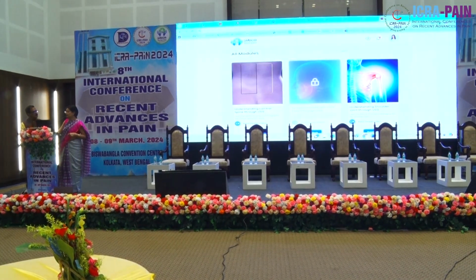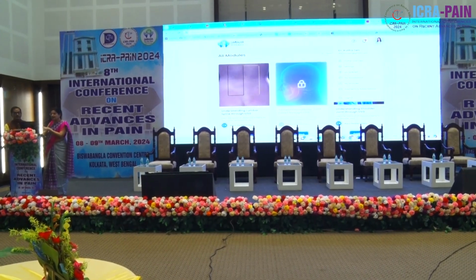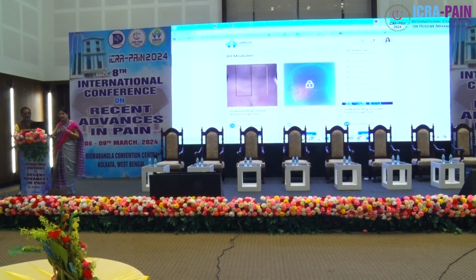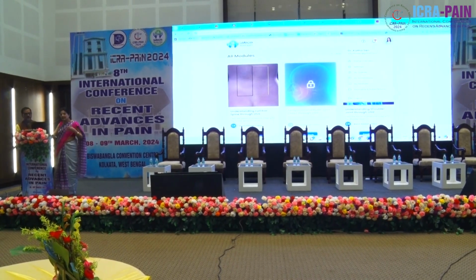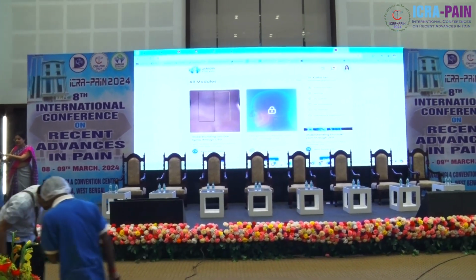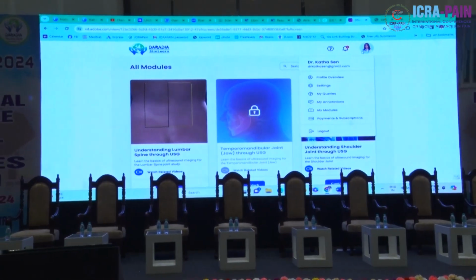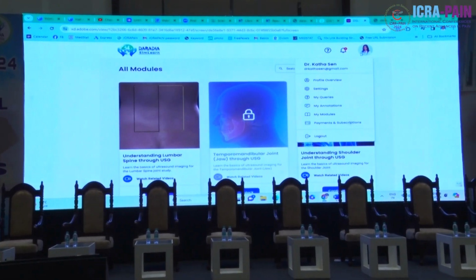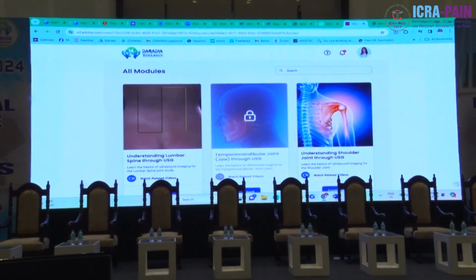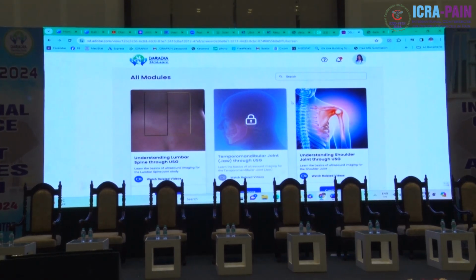When you come into your profile, you'll have a fair idea of what your class is about, what annotations you are making, and what your queries are, because tomorrow you might want to use this and make a paper. As a user, your details will be saved here. I will not show you the home page because we are still not on a cyber secure place.